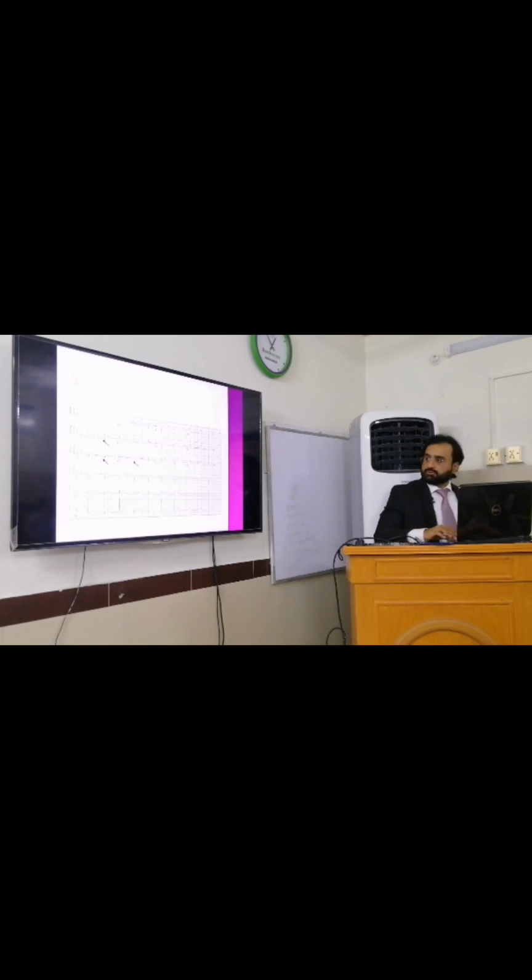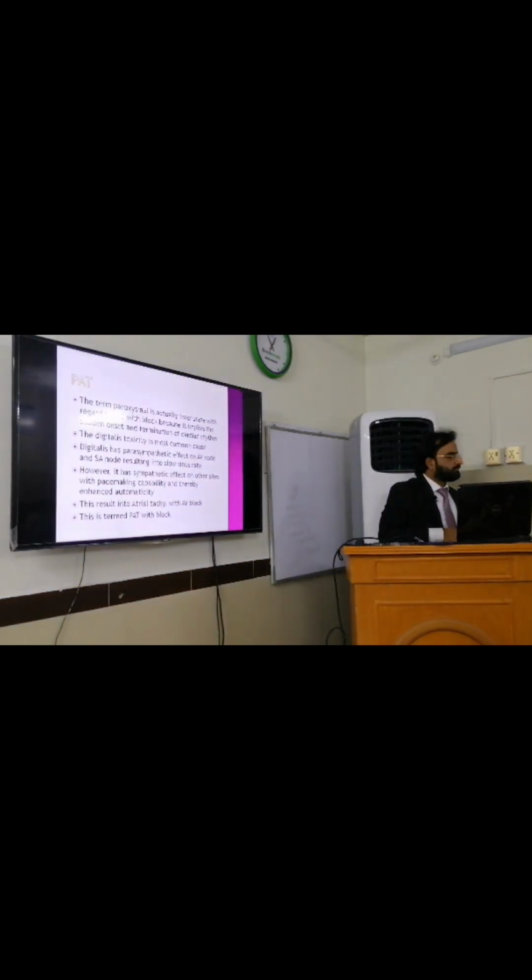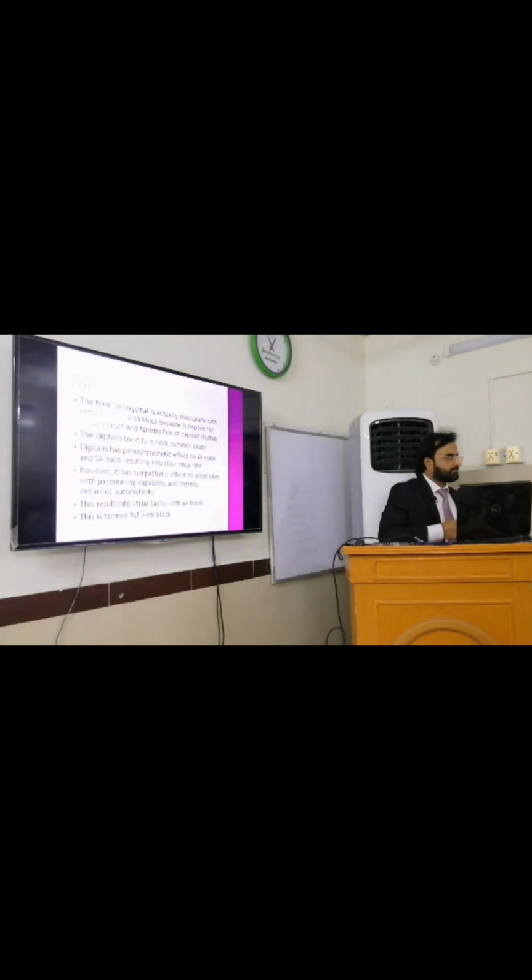Okay, so this is the ECG depicting the atrial tachyarrhythmias. This was called accelerated atrial rhythm. Why do we call it accelerated? Because the heart rate was a little bit on the higher side. It was in the range of 120 to 130. Hence we call it accelerated atrial rhythm. This is one of the varieties of the atrial tachyarrhythmias. You would sometimes see such an ECG in patients.